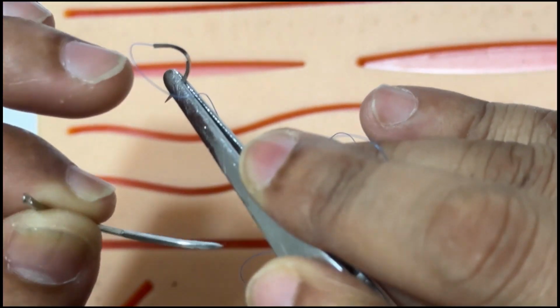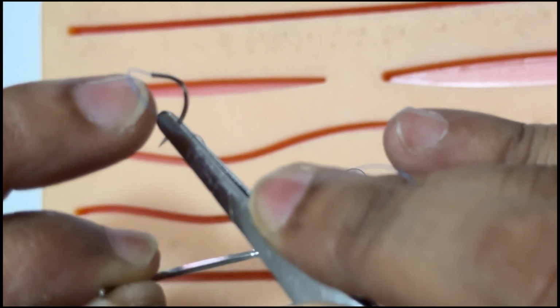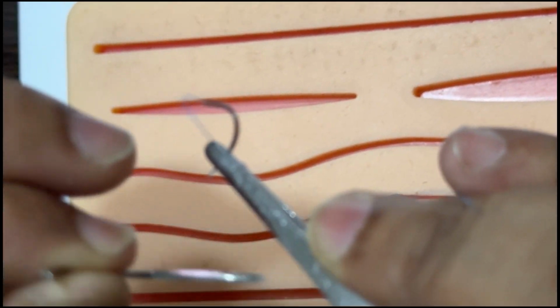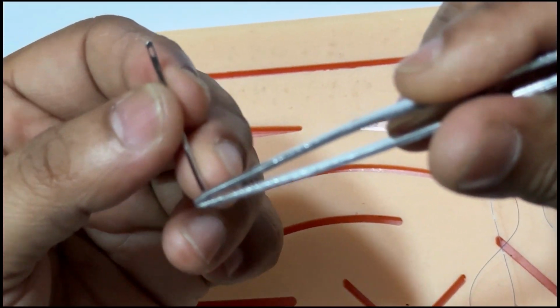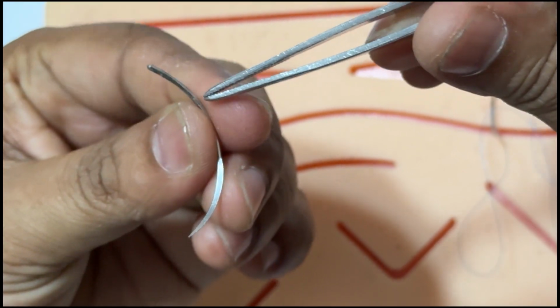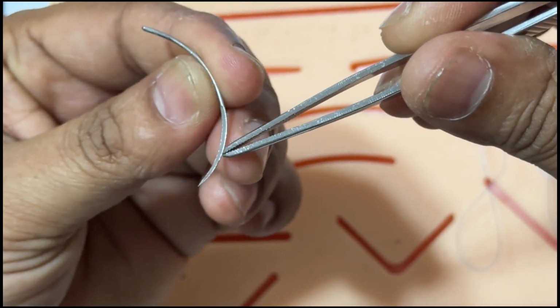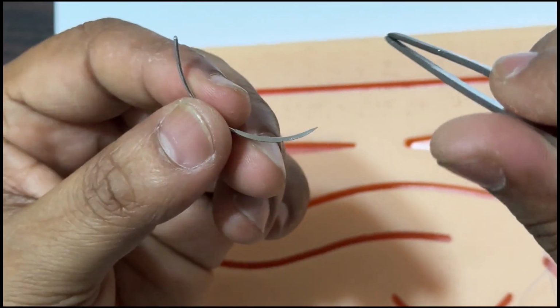So in the swage needle, by manufacturing itself, the thread has been embedded within it and clipped. Understood? This much clear? Now what about the portion in between the tip or the point and the eye or the swage? This portion in between is called the body of the needle. Understood the point?